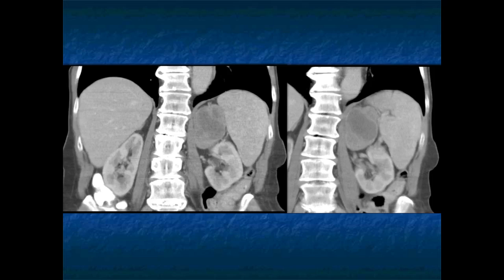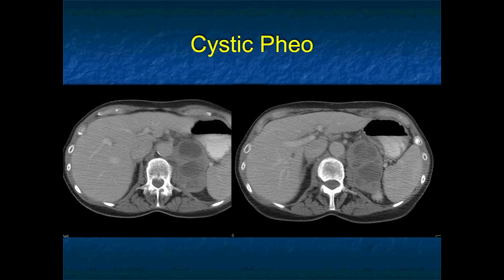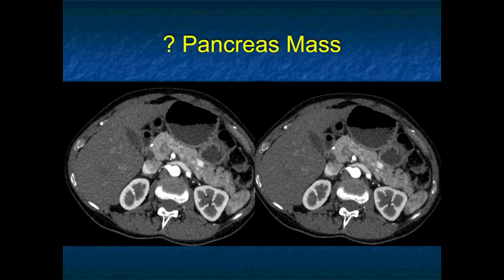Metastasis, but there's no known primary, and that usually does not present as hypertension. This was resected and was a cystic pheochromocytoma. Pheos can be cystic, but typically are more vascular. This wasn't vascular. It's kind of an atypical look for a pheochromocytoma.